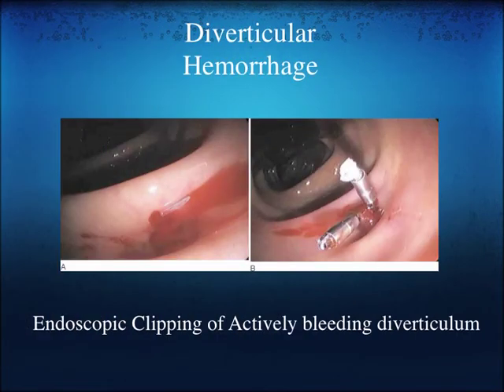And here's an endoscopic picture of diverticular hemorrhage. Often we don't see this bleeding from one tick. The most common thing is looking in and seeing clots and hundreds of diverticular orifices and trying to guess which one is the culprit, the needle in the haystack problem. But in the rare circumstance where you can actually see the bleeding site, you can place endoscopic hemoclips, as was done in this slide.